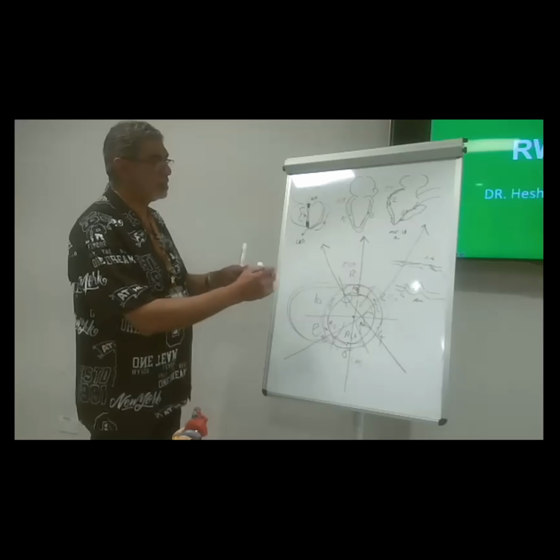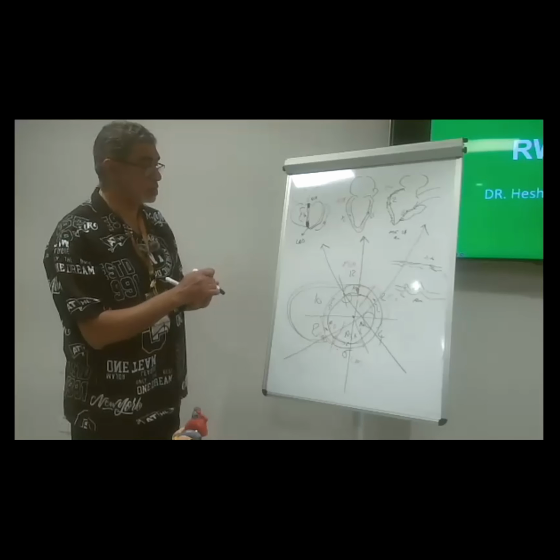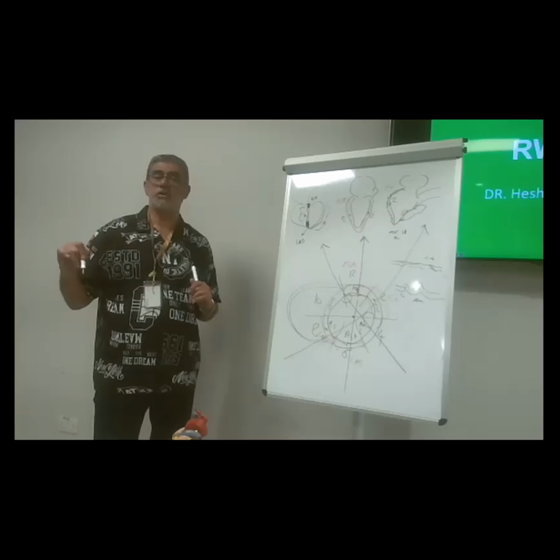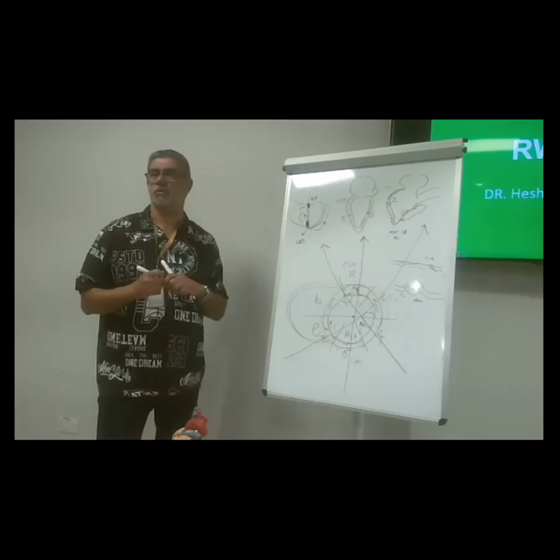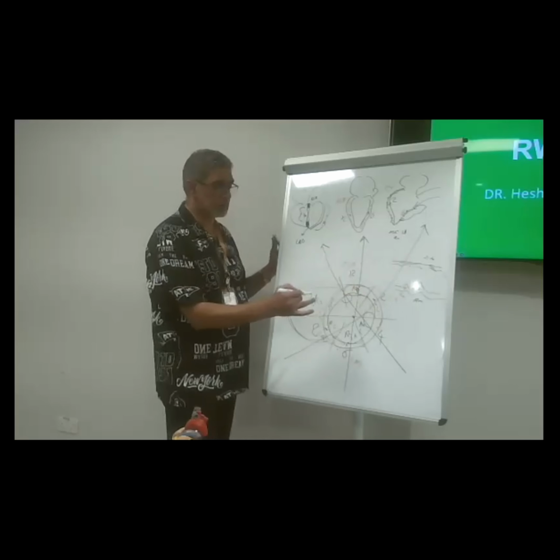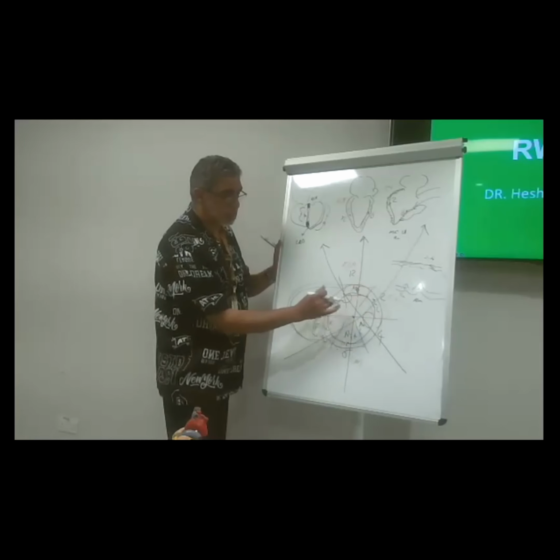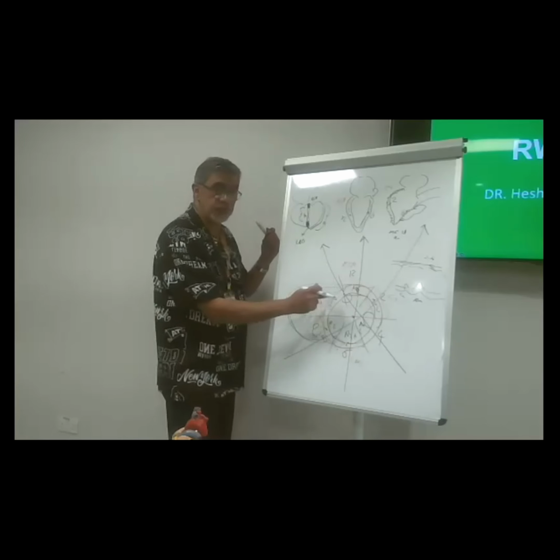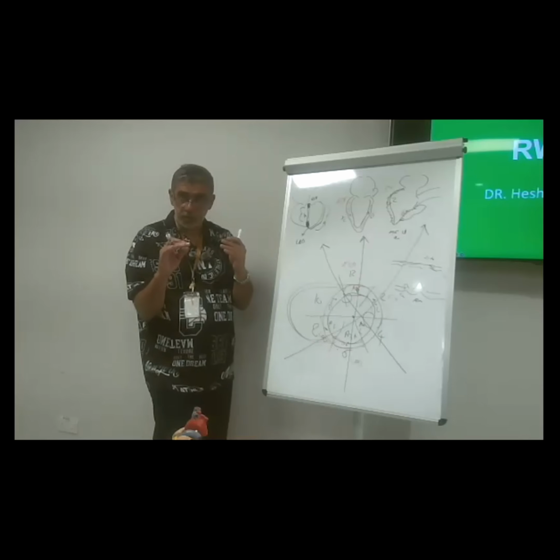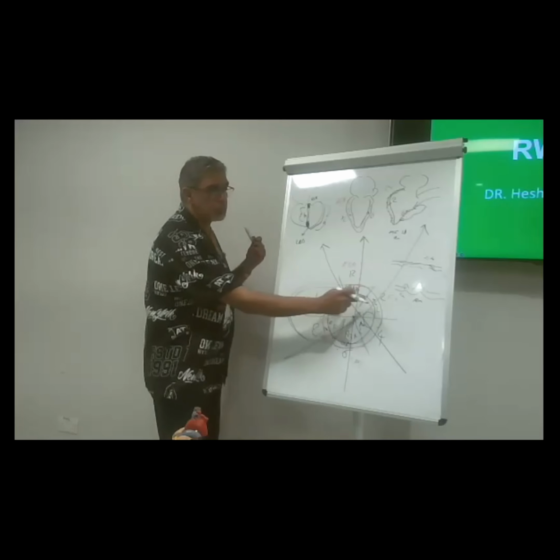So we made the thickness, we made the excursion. Another point is tethering. In such a patient with an akinetic inferior wall, it will be bordered by this wall and this wall. So you imagine that this wall is moving. It's not moving, but it looks like moving due to what's called tethering. It's pulled down with those normal walls.